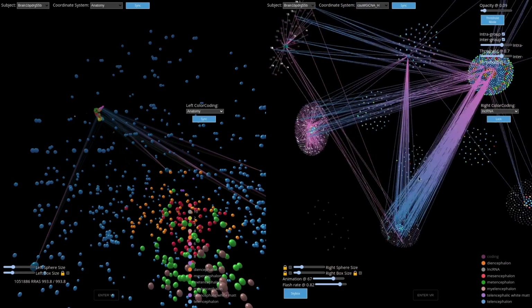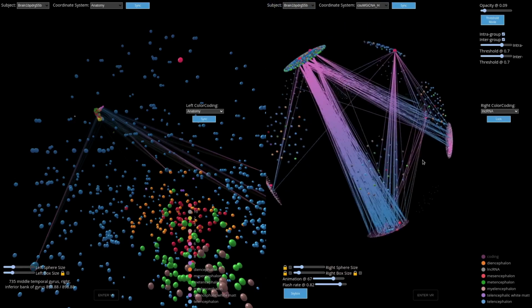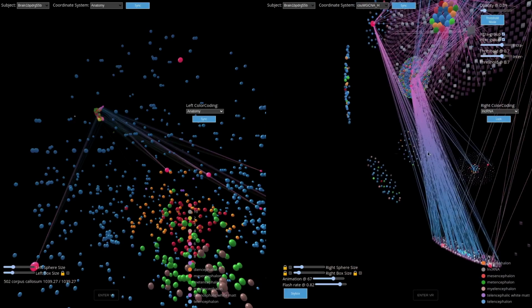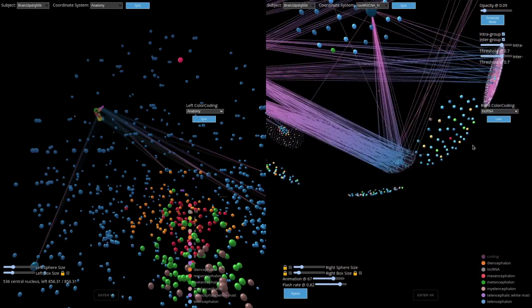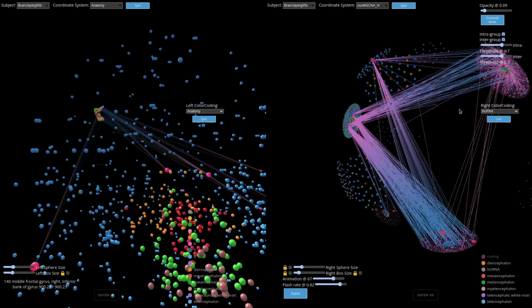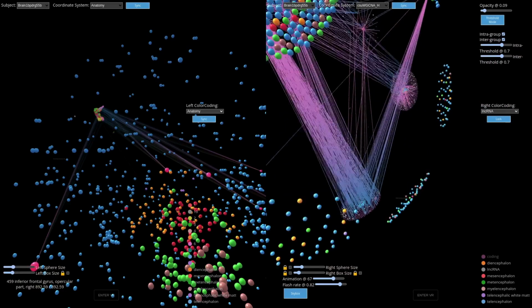Change, so we can see the brain as the multicolored spheres, and the two colored blue and pink cubes are going to be the long non-coding RNAs and the regular protein coding RNAs.